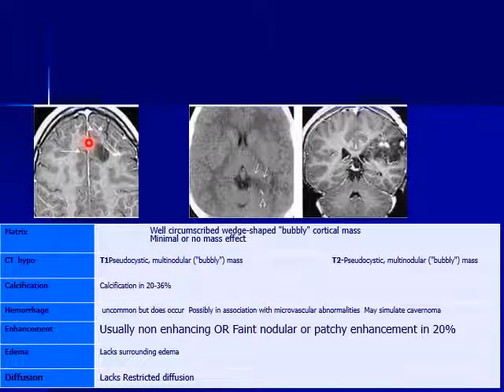These are the different patterns. Bubbly appearance, okay, bubbly appearance in CT hypodense. I wanted to tell you that when we say that we have a peripheral lesion or cortically based lesion, put in mind that some deep structures like these gyri and this area of gyri are also cortical, like this one. And of course, we can see some nodular enhancement in 20% of cases.